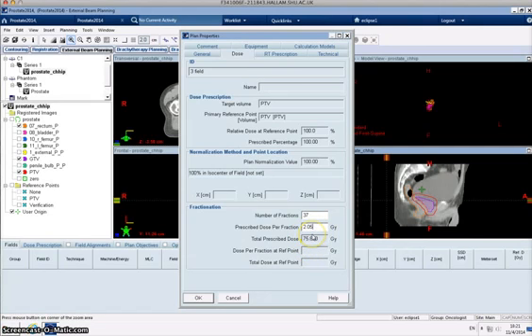The easy thing to do is this, so we could do 76 in 37, which is the common way we're used to writing things down, and if we do that we can see we're giving the patient nearly 3000 gray, so that hopefully highlights that to us. So 2.05.